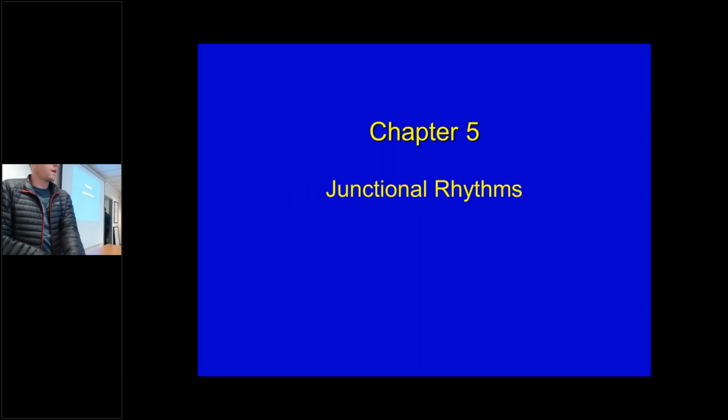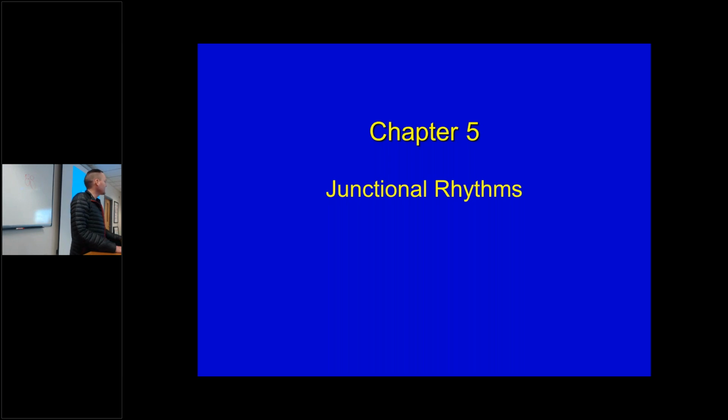So real quick, before I get you a tree, in recognizing rhythms, on paper it's always easy to say, well, P waves are going to be inverted with this. But actually recognizing it on an EKG, looking at an EKG and being able to say, well, that's AVNRT, or that's AVRT, or that's atrial tachycardia, is more difficult, right? We'll go over that. You guys have all the practice strips, right?